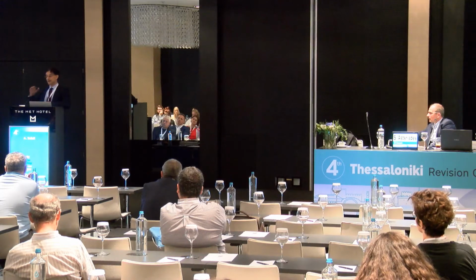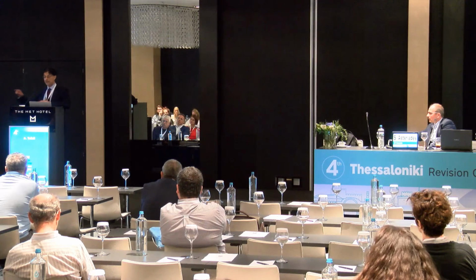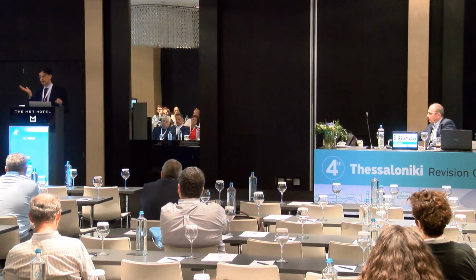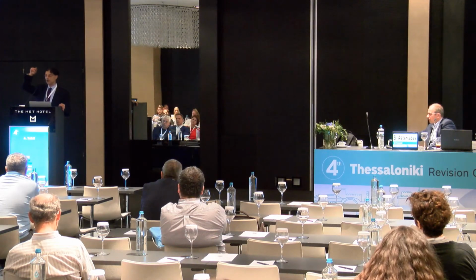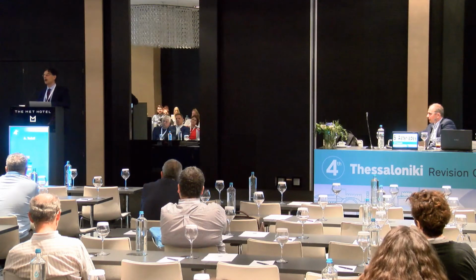So in terms of anatomy, I can understand why they are, but what we don't understand is whether one leads into the other. So one assumes they must do, because in order to get dilated endpoints, if you have a branching vascular network, you must have that to begin with. But you have the other form, as I showed on the OCT, of the really sharp PEDs with really large vessels going through it. So there may be subtypes within that. So I think there's still a lot for us to understand about the evolution.